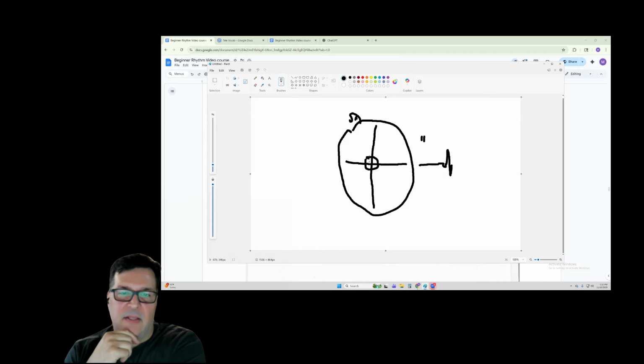So that is if it's happening high in the junctional area. If it's happening someplace in this middle septum, it's going to be buried inside the QRS complex. If the junctional P wave is happening someplace in the lower junctional area, it's going to be retrograde after the QRS complex, and then into a T wave. What are your thoughts on that?